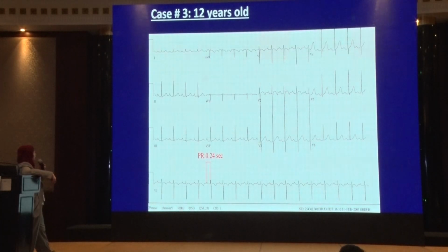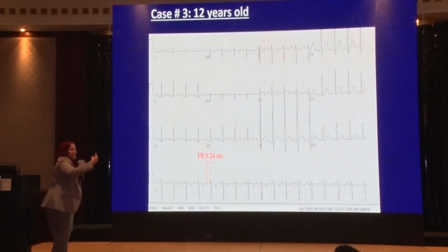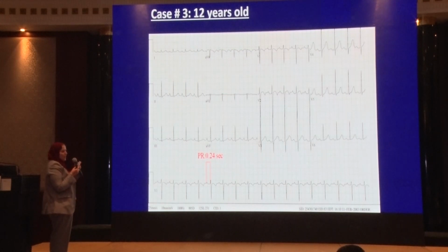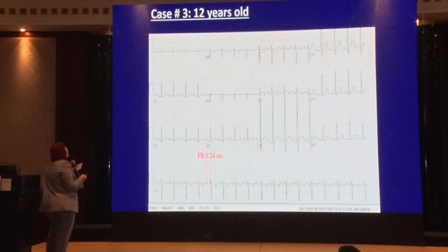Okay, so this ECG, who's going to work with us? Doctor, stand up. Calibration, bravo. Yeah, okay. Rate.